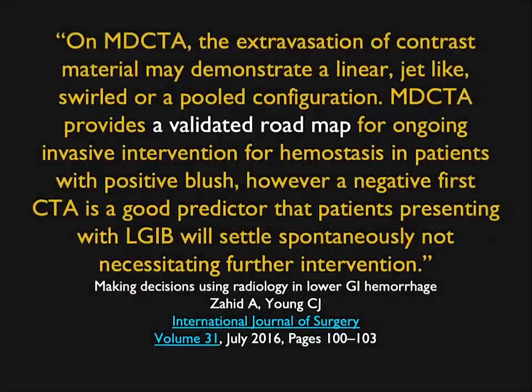Another article, Zahid: extravasation of contrast material may produce a linear, jet-like, swirled or pooled configuration. MDCT provides a validated roadmap for ongoing invasive intervention in patients with a positive blush. However, a negative first CTA is a good predictor that patients presenting with lower GI bleeding will settle spontaneously, not necessitating further intervention. Basically, it means if the CT is negative, stop and follow the patient.